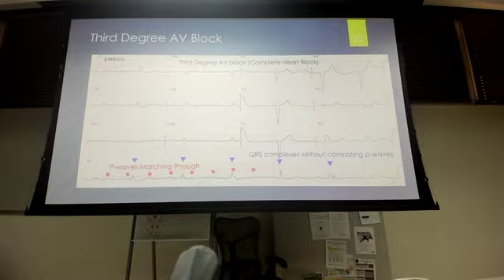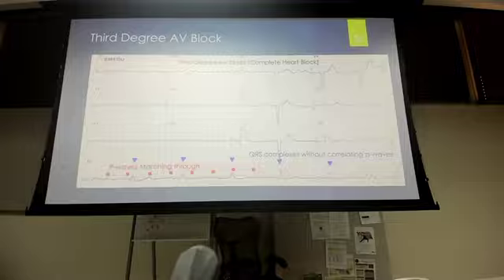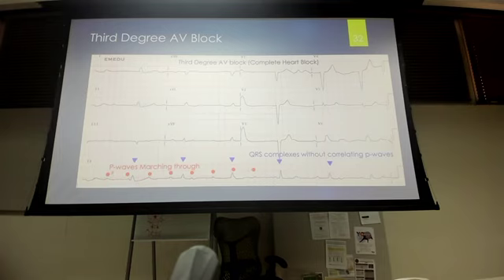It looks like a bradycardic rate by QRS complexes, right? That's what our pulse is, our QRS complex, our depolarization of the ventricle. So it looks pretty slow. Okay, now I've got to identify, do I have P waves? Well, really, I wouldn't blame you if you didn't notice there's a P wave, but you can look here and say, okay, that P wave looks to be okay. But I don't see specifically a P wave that's associated with this. Maybe that's it, I don't know. Okay, same thing here, I don't see it.